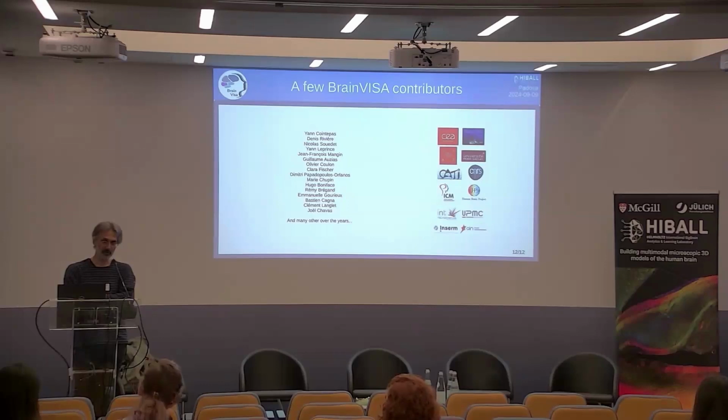Also the sulcal extraction quite often makes a little bit more ramifications, some of which are real, but not all of them, because some are segmentation artifacts. There are some parameters or thresholds inside the software that could be adjusted, should be adjusted, but we haven't done it yet. I hope you might work on that. It'd be interesting. But, right, thanks.